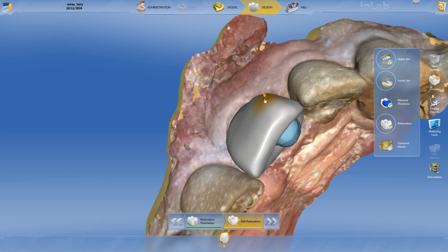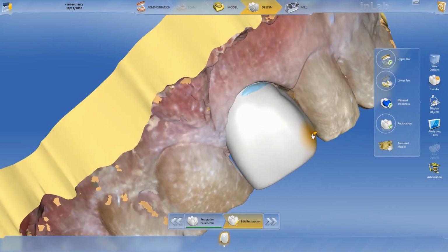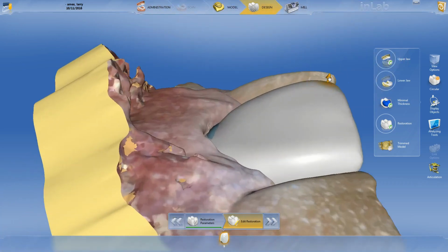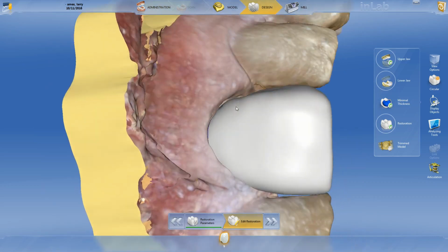So for this case, say this contour line isn't supposed to be all this round. You'll then bring it in. And that's good to me. And you're going to look at this from every angle. So even from this side view, you're going to make this all ideal, because this is what you're adjusting now. You've got the contact. Now it's just making sure that contour line looks natural and gets the illusion done, I guess you could say. Because that's all we're doing. We're just making an illusion.